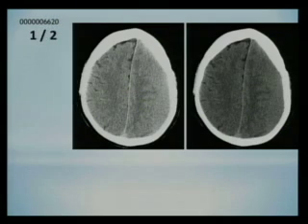This is another patient with a hematoma, and it is very difficult to see. But when you look at the hemispheres, you see that in the right hemisphere there are still sulcal markings. Not complete sulci, except for here laterally, complete sulci. But they're there. On the left, there is nothing like that. This is just chock full of edematous brain tissue. Not because something initially inherently abnormal in the brain per se, but because of an overlying layer of hemorrhage.